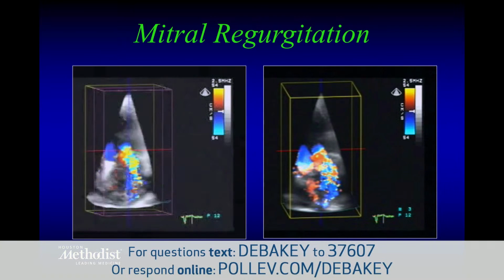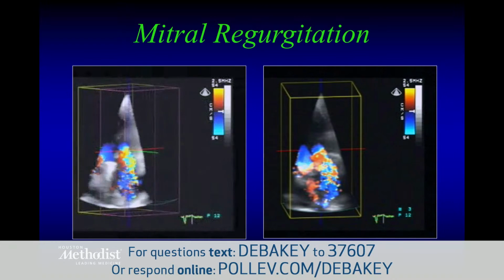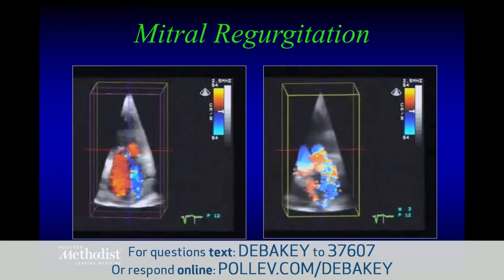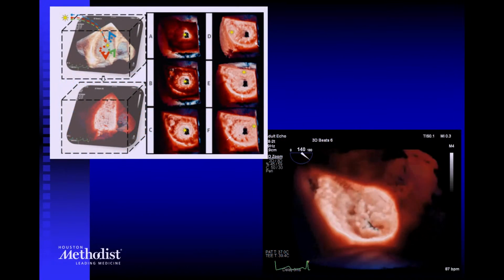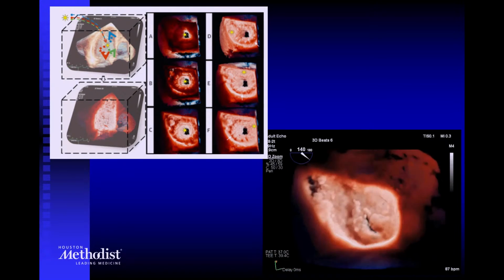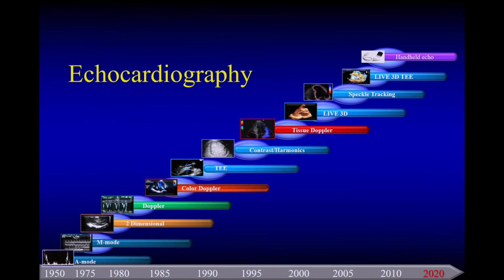So many of these apply much more from the transesophageal approach, but I think further enhancement in resolution will certainly help when we are able to quantitate using 3D approaches. And with some of these newer techniques of enhancing our images, it really is quite impressive just how advancements in computer technology have enhanced our ability to image this heart using the same principles of ultrasound.